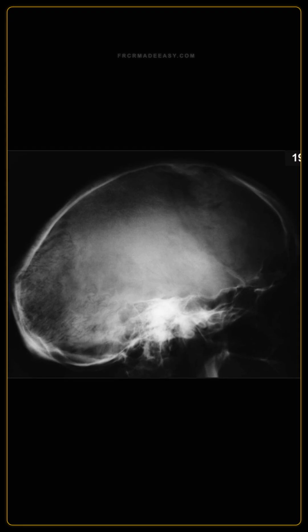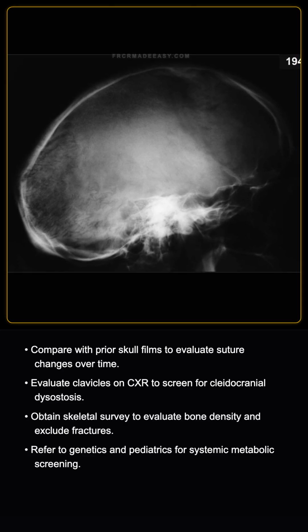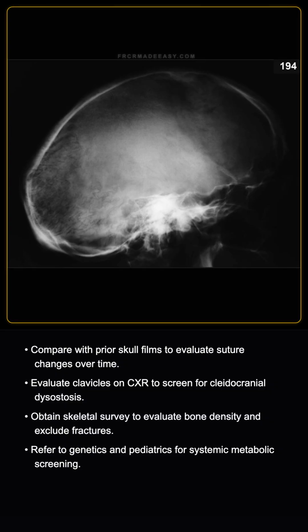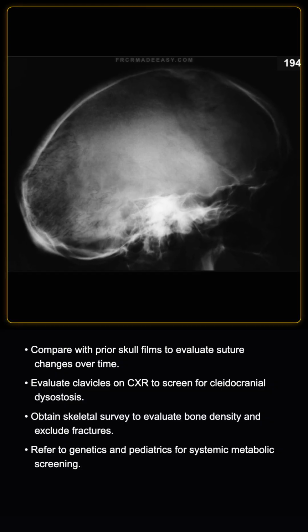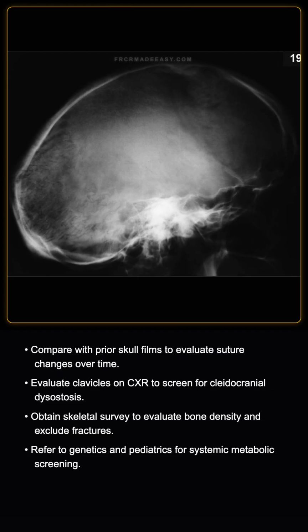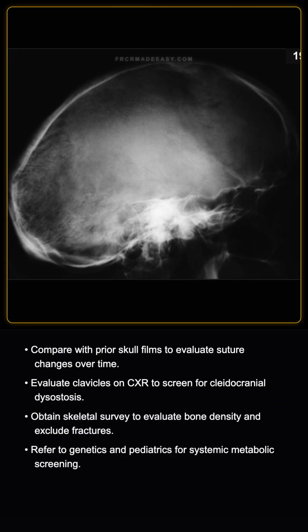How would you manage this patient as a radiologist? As a radiologist, I would recommend comparing this skull radiograph with prior cranial films to assess chronicity. I would suggest checking the clavicles on chest or shoulder radiographs to evaluate for cleidocranial dysostosis, and checking skeletal surveys for fractures, osteopenia, or osteosclerosis.